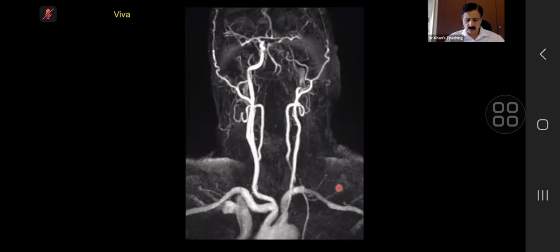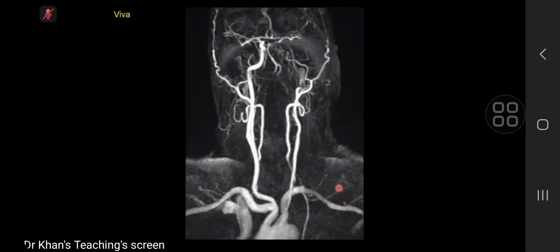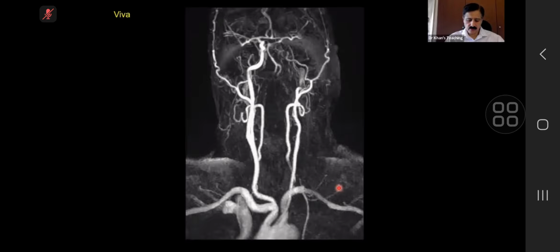So I've got an ICA thrombus relatively proximal, so inferior, prior to it going into the brain, so in the neck. Just distal. Okay, so your conclusion is? I've got a critical ICA, either filling defect or stenosis. And I'm concerned that there would be anterior circulation infarct or ischemia.